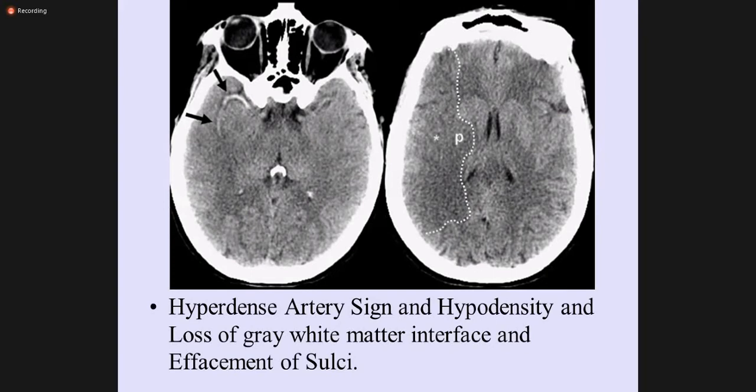Another sign which I have told you about is the mass effect. So this is causing partial effacement of the ipsilateral lateral ventricle.